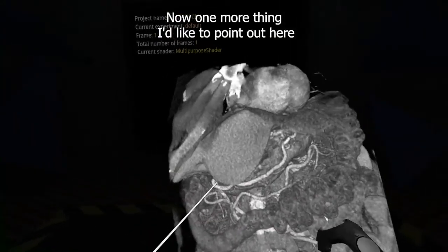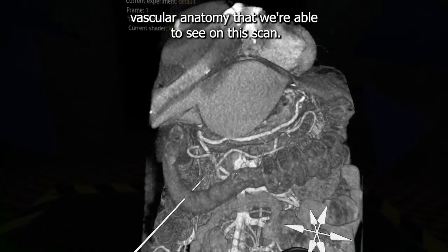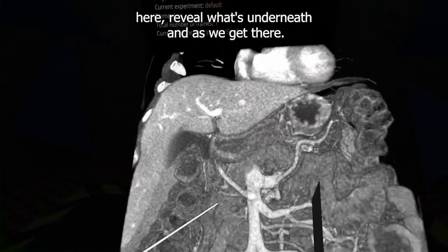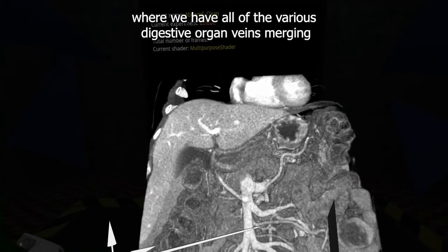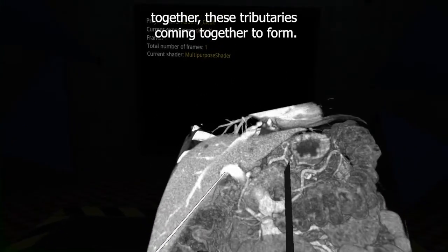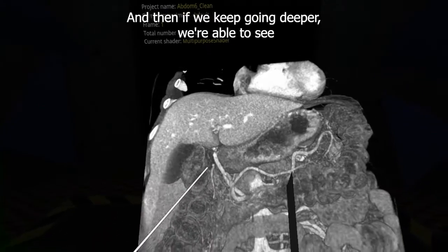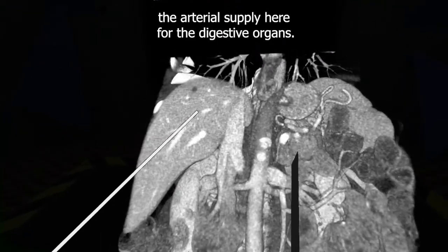Now, one more thing I'd like to point out here is some of the really clear vascular anatomy that we're able to see on this scan. So I'm going to start to cut through our intestines here and reveal what's underneath. And as we get there, this right here is where we have all of the various digestive organ veins merging together, these tributaries coming together to form our hepatic portal vein right here, and we can see that heading into the liver right there.